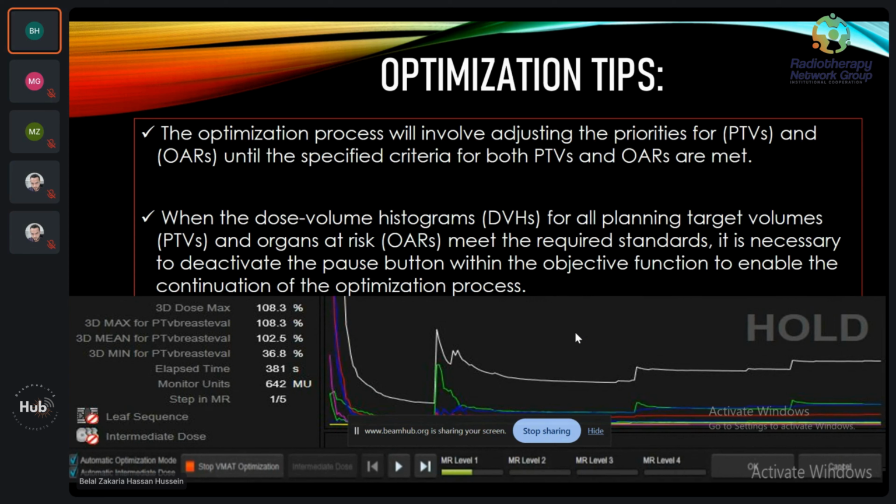Level 3 can make small modifications again if you have both this level and follow this parameter and the DVH. If you get the best coverage and the organ at risk acceptance criteria as you want, again complete level 3 and level 4.